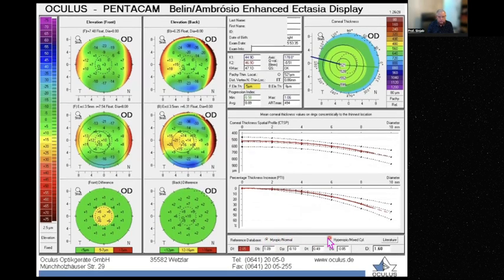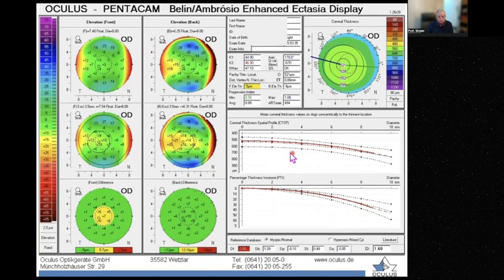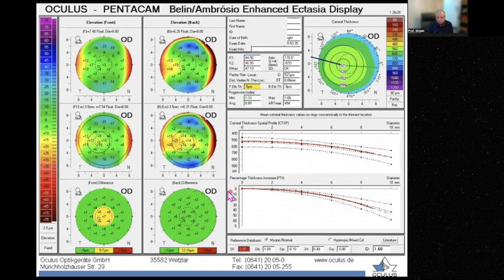If the patient is hyperopic or has mixed astigmatism, then this one should be clicked. This one is for myopic and normal, so emmetropic, and this one for hyperopic and mixed astigmatism, because the values will differ. So knowing the refraction of the patient before telling whether this is normal or abnormal is very important.